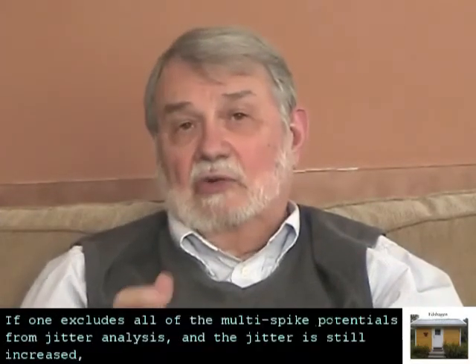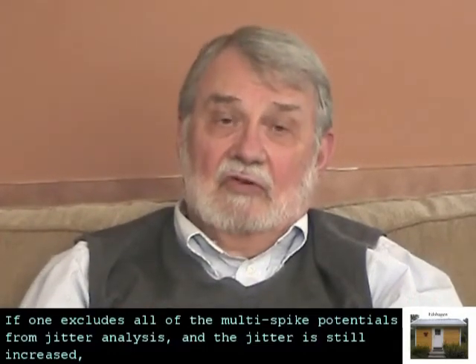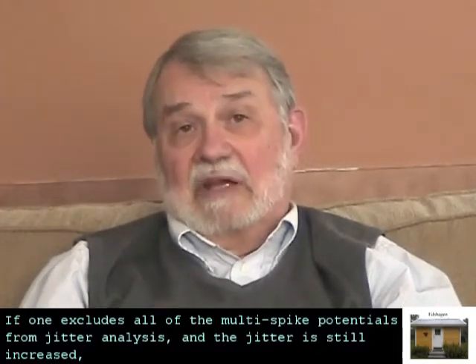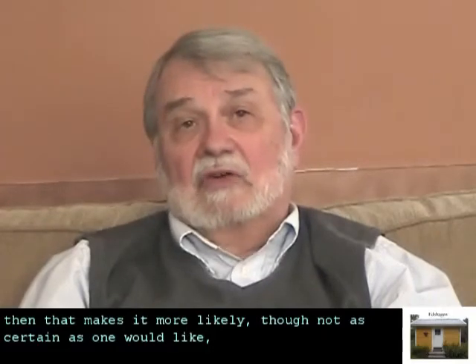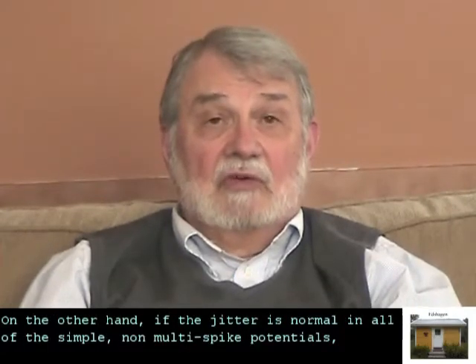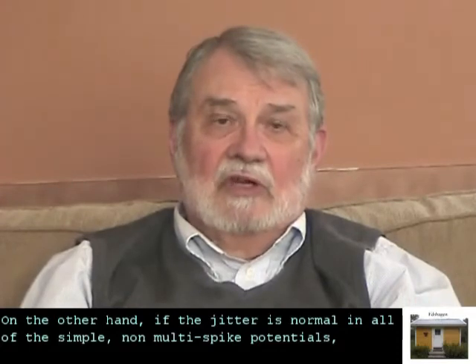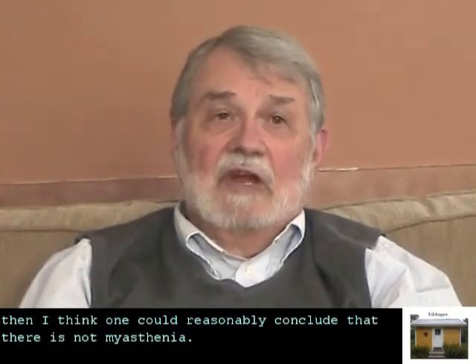If one excludes all of the multi-spike potentials from jitter analysis and the jitter is still increased, then that makes it more likely, though not as certain as one would like, that the increased jitter in the remaining pairs of potentials is in fact due to myasthenia. On the other hand, if the jitter is normal in all of the simple non-multi-spike potentials, then I think one could reasonably conclude that there is not myasthenia.